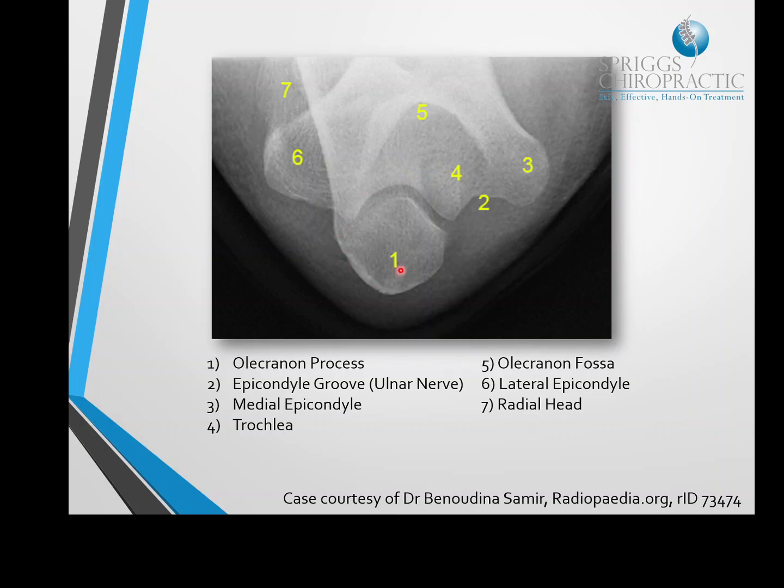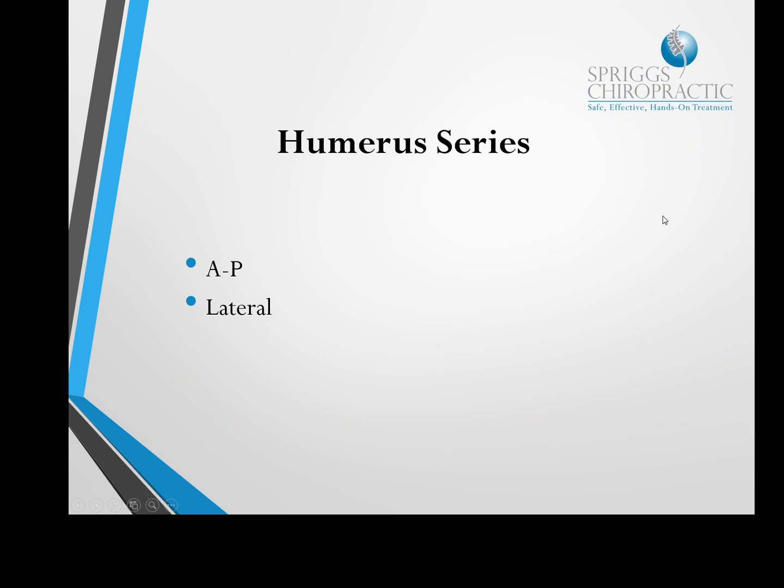This is again a slightly unusual image. It's not a standard view in most A&E departments. However, it is available to you should you need it.